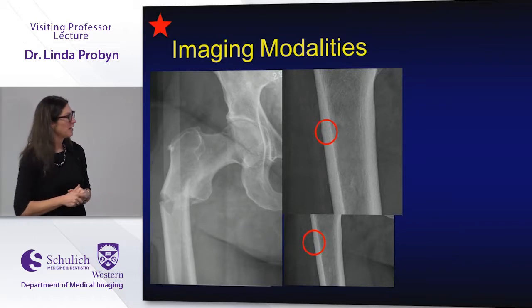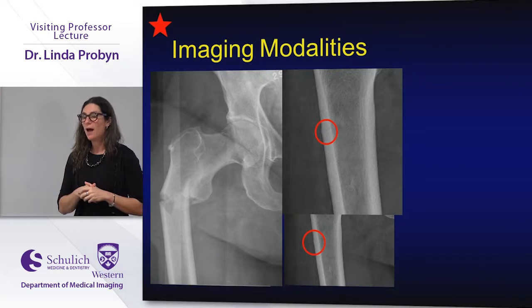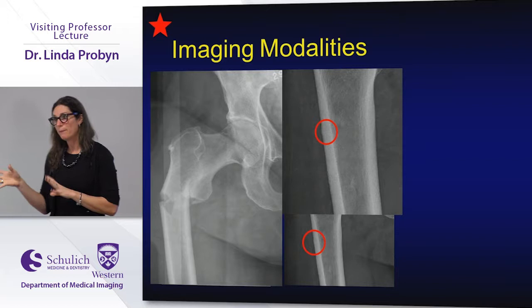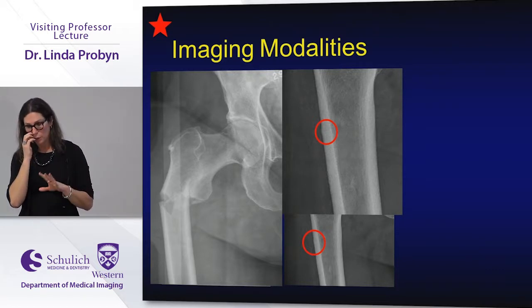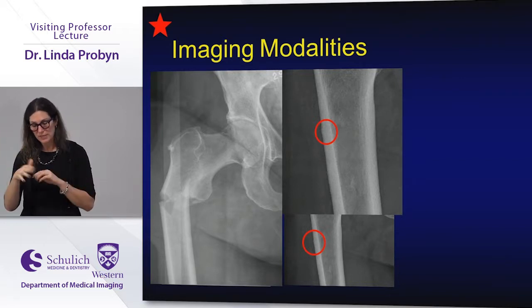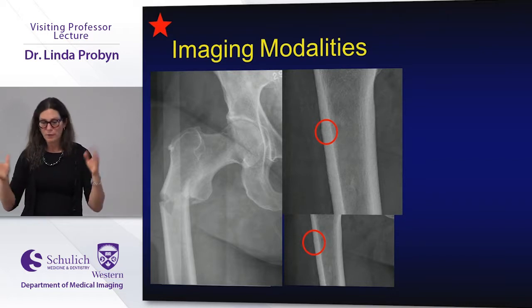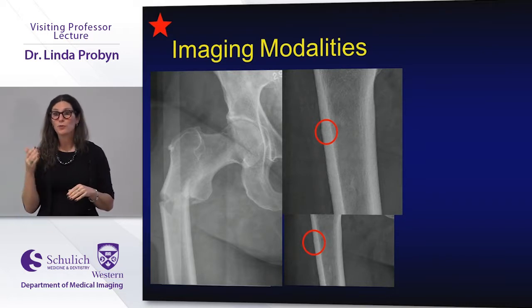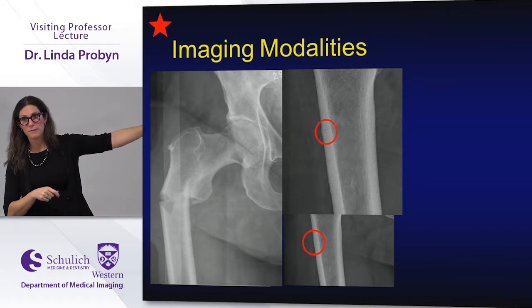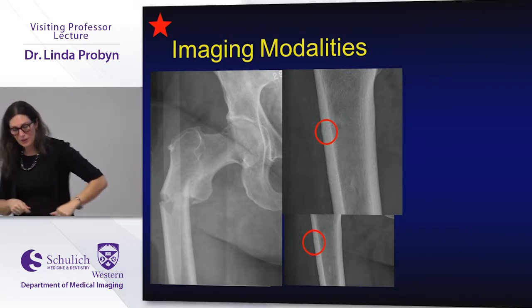So what happened with this patient, this is the case I showed you at the beginning. Patient came into the emerge. The history we got was rule out OA, hip pain rule out OA. The x-rays were done, called normal, and this is a true story. Patient was sent home. There's a CT, which I'm going to show you in a minute as well. Patient was sent home, follow up with the family doctor, walked out of the hospital, and tripped on the way out. These two images are about 2 hours apart. So they completed the fracture, and got back into the emerge.